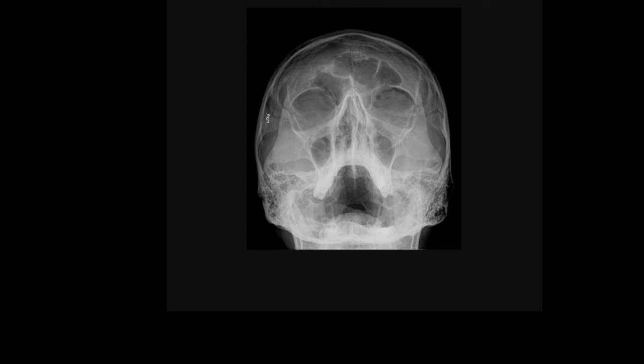This is a skull radiograph in the Waters view, and the abnormality in this radiograph is this crescent-like lucency projecting under the left superior orbital rim. This is known as the black brow sign, and it indicates a fracture of one of the paranasal sinuses associated with the left orbit. This is some air from the paranasal sinuses extending into the orbit.